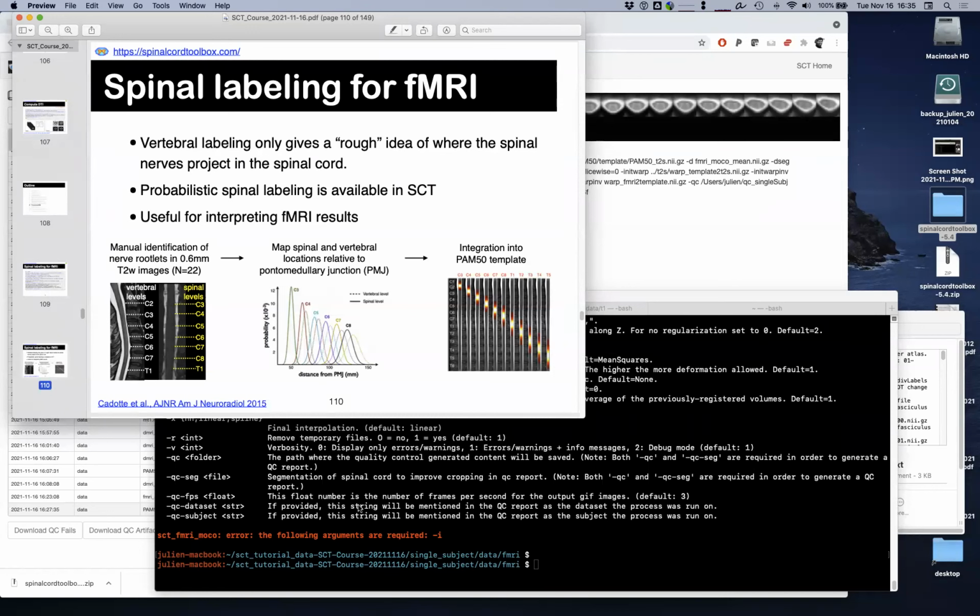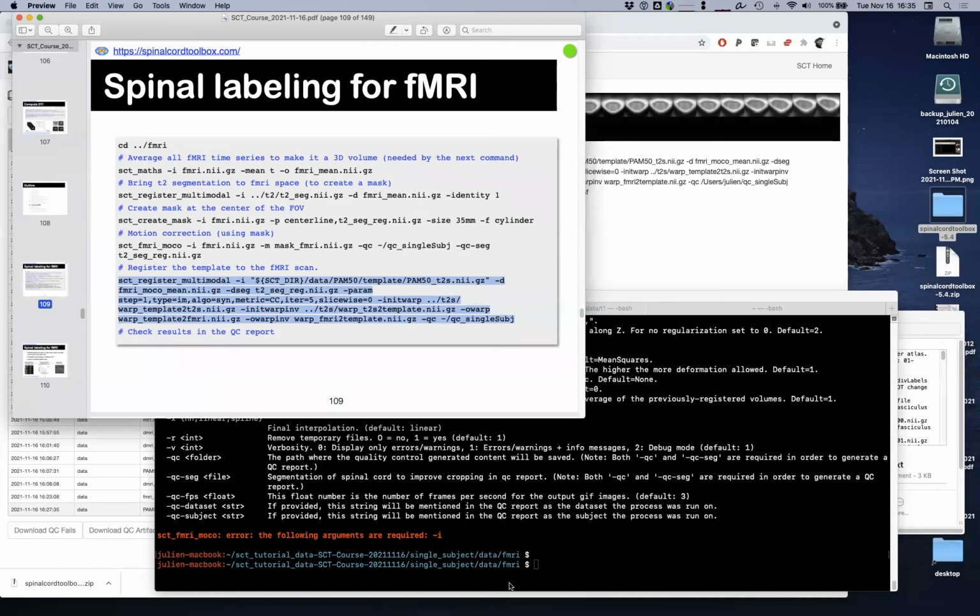Oh yeah, Ken. I just had a question back with the registration of the command you ran. So you used the intensity of the image for this registration, right? Correct. And the reasoning for that is because the automated segmentation doesn't work, and you want to make this automated. I guess in my pipeline I manually try to identify the cord as best as possible. Okay. Just your thoughts and the reasoning for that.